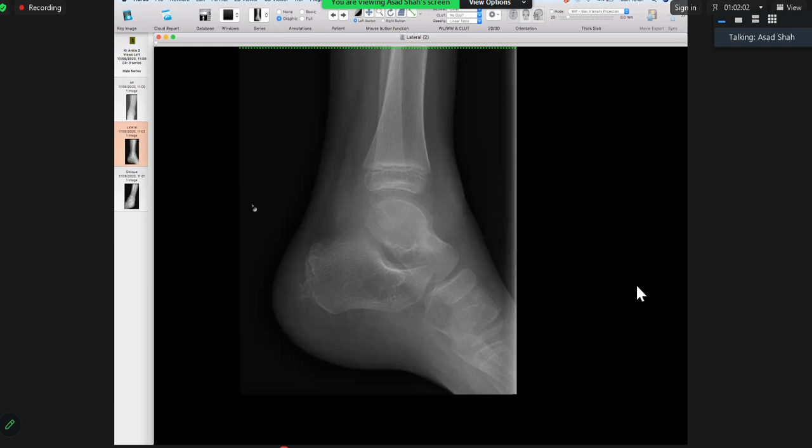Let's say out of hours, if the patient presents to ED and you are on call and this X-ray comes to you, then there is one kind of cheap test that you can do, isn't it? What will that be? There is some lucent lesion with surrounding sclerosis in the talus. Which part of the talus? In the region of the neck of the talus.